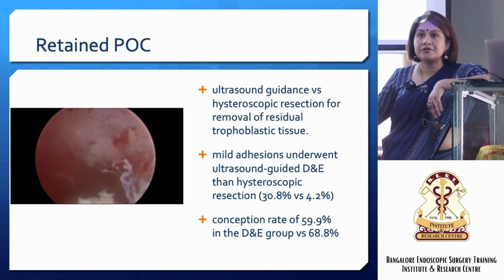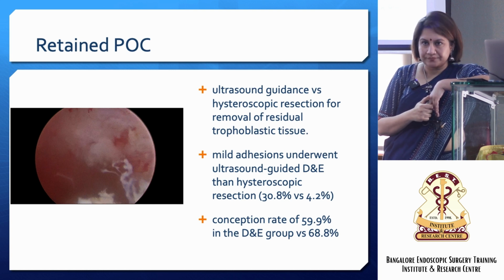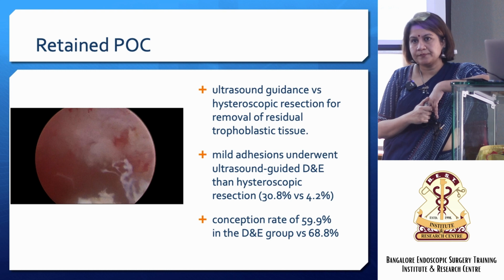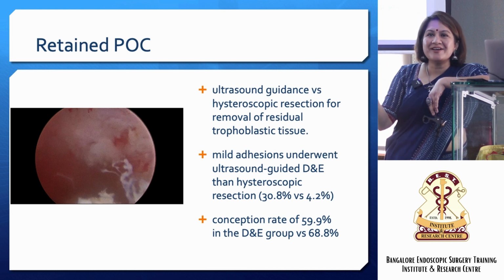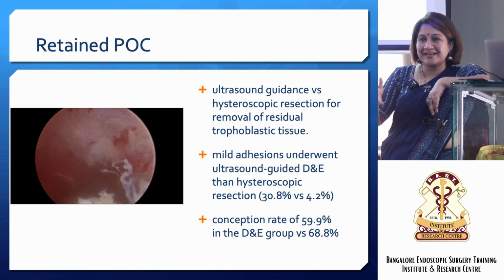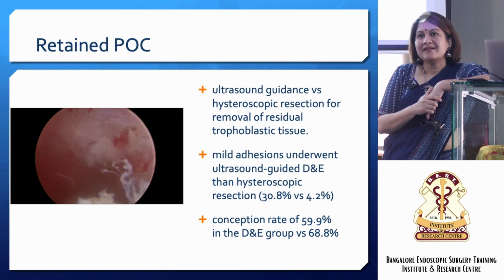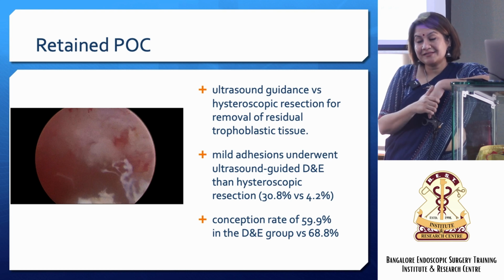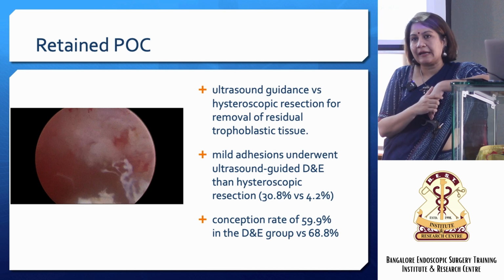Unlike this, retained products will be in the endometrial cavity. So you can make out, very vascular. I'm not that good at scans, but good enough to see what's in the cavity and what's in the myometrium, at least you can discuss that with them. Seriously, that's the first time I saw AV malformation coming up in my patient after 1 month. I still don't know why that happened.